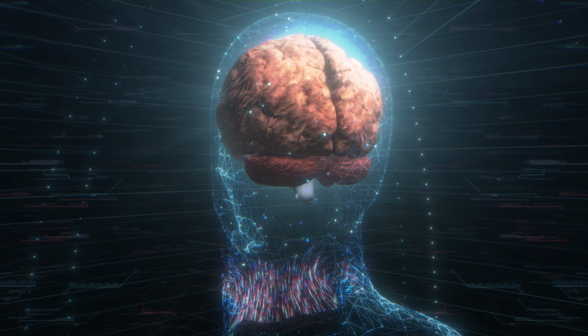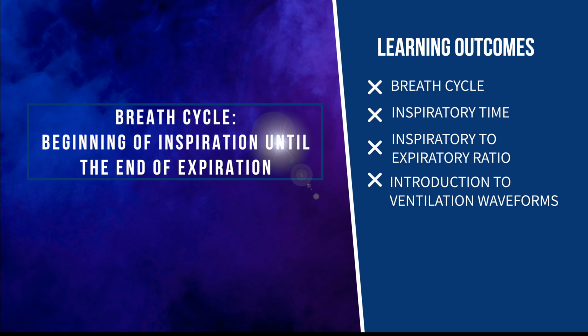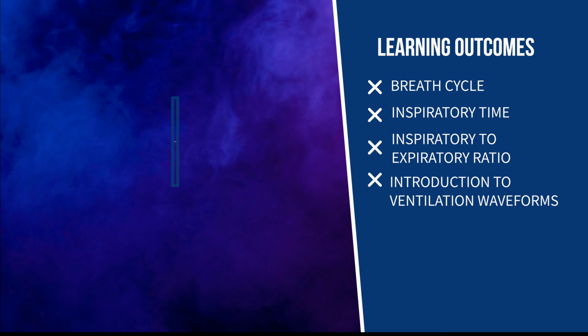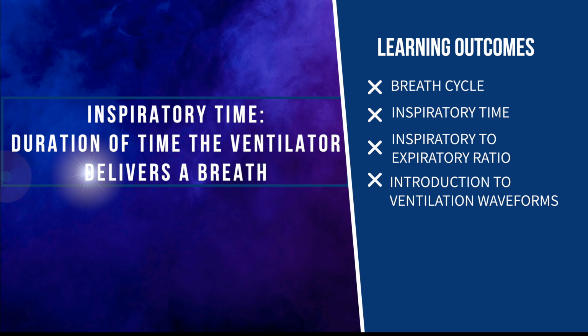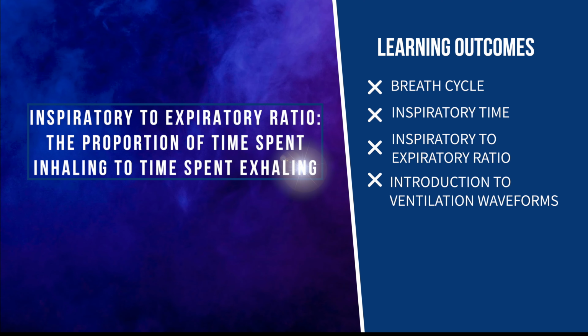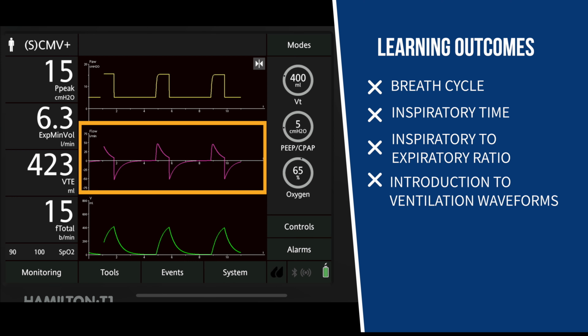This learning module covers the breath cycle, inspiratory time, and the inspiratory to expiratory ratio. It also includes an introduction to the flow waveform to illustrate the lessons.